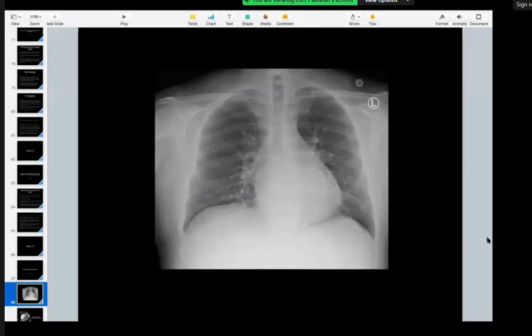There are no pleural effusions, maybe some impression of slight upper lobe blood diversion, but no frank alveolar edema at this stage. I can't assess with the image quality that I'm currently getting for interstitial lines. But I agree with that. In this context, with contrast enhanced CT.